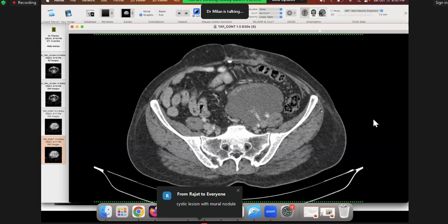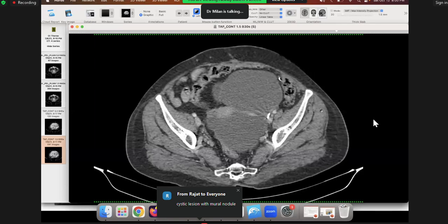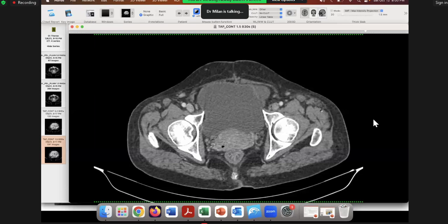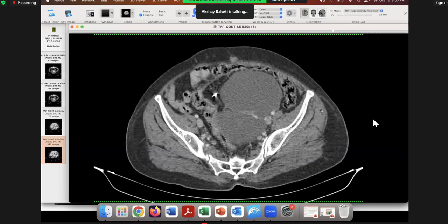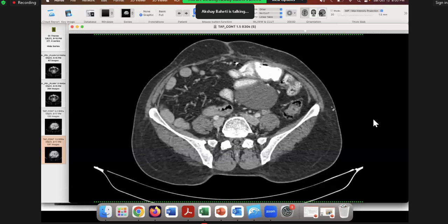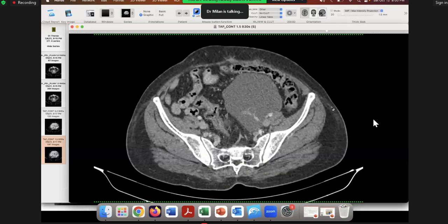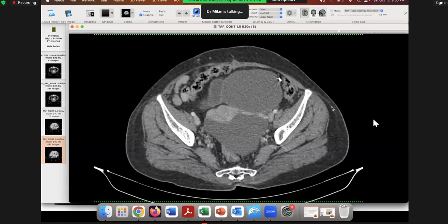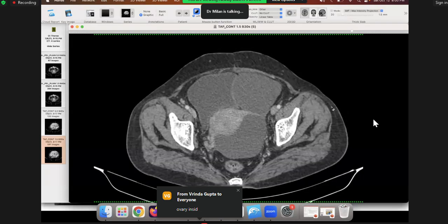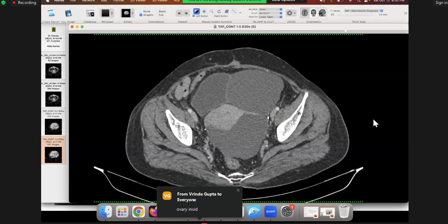Because there is a history of surgery prior to this, it looks like a peritoneal inclusion cyst. Excellent. Very good. So why do you think it looks like a peritoneal inclusion cyst? What makes you think so? Because it is cystic with no solid component, and it is insinuating along the adnexal structures, the left fallopian tube, and Good. Very good.